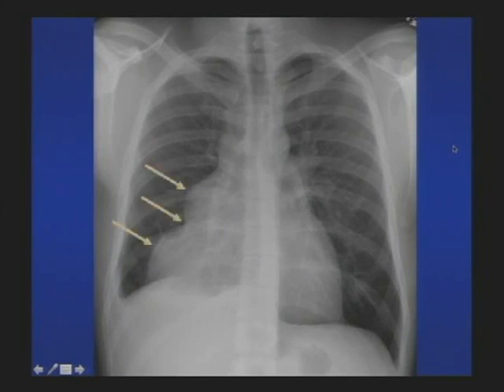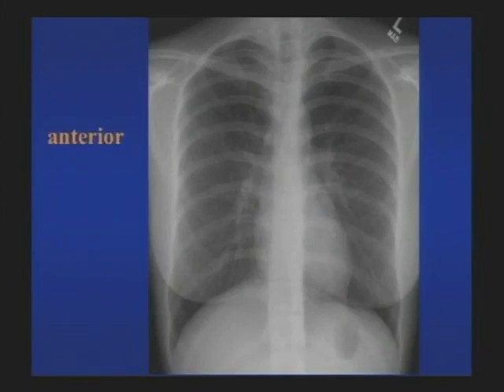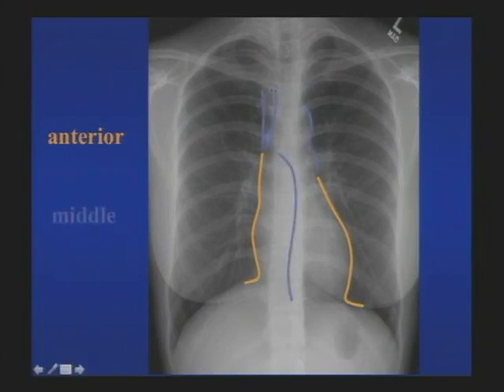What's missing here? Well, the right atrium is missing. So the right atrium is obscured here, and in general, we consider the heart an anterior mediastinal structure. And so that'll give us a clue. So anterior mediastinal stripes and lines would be the heart borders, primarily. The middle mediastinum is going to be SVC contour, if you see it, or right paratracheal contour.